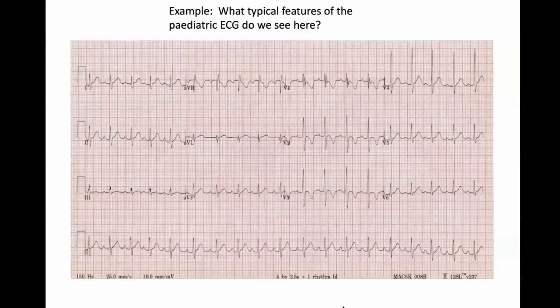Now, I would like to open the floor. We've got one example. Can somebody tell me what typical features of the pediatric ECG we see here?